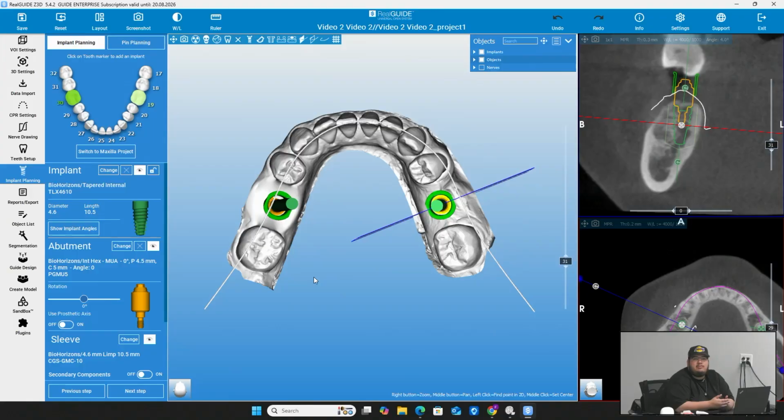treatment plan. So this is a good tool to know so you don't feel like you have to make two different separate treatment plans. Of course, I know this is all on one single jaw, but some doctors might only want quadrant guides. Another thing this can be useful for is to save material on your printer rather than making a full arch guide. You can go ahead and make two quadrant ones that will take less material and would be more efficient when it comes to speed, if you need to print them out same day or anything like that. Without having to go back and make different treatment plans, we can just select which ones we want to make in the actual guide making software process.